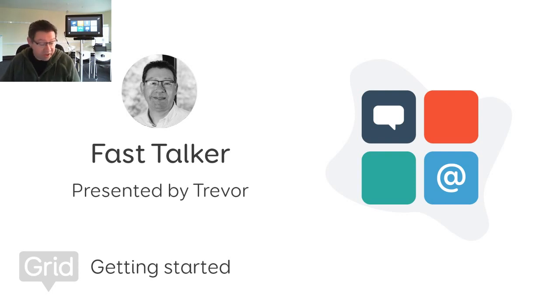So Fast Talker within Grid 3 is really an all-in-one resource which combines fast and efficient communication with accessible apps like email and SMS and camera and web browser, social media and so on, with computer control and environment control as well.